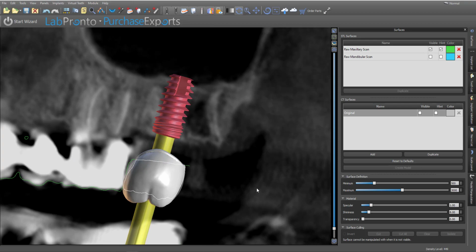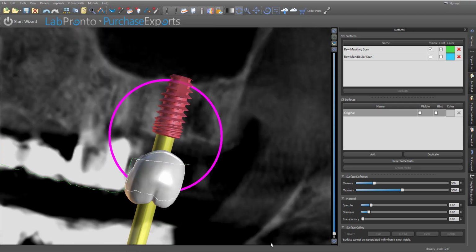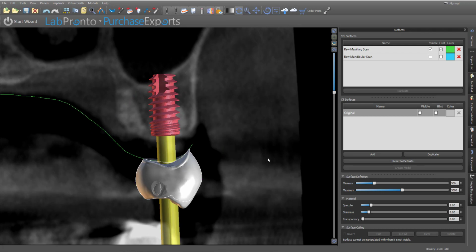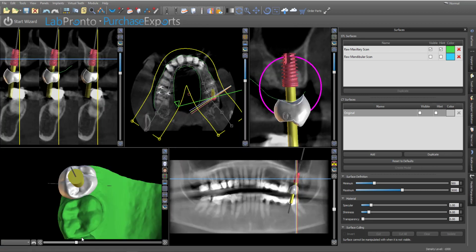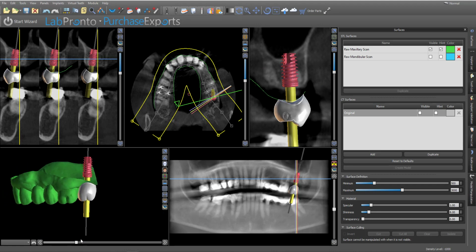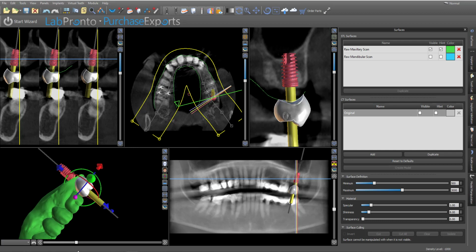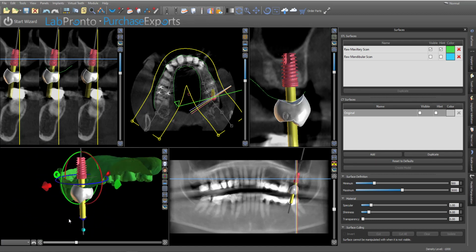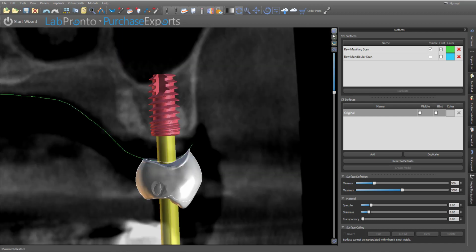Even in a second molar in a porous maxilla, I'm not terribly worried about that. There's a root tip to get out. That shouldn't affect things too much here. So I would probably plan on doing this with a very minor sinus bump. Wouldn't even use graft. I'd just breach the sinus floor. And that basically completes the crown down planning, okay? Because we designed the final crown, we've planned it with regard to the ideal restoration and gingival margins, and this is a lot more valuable.